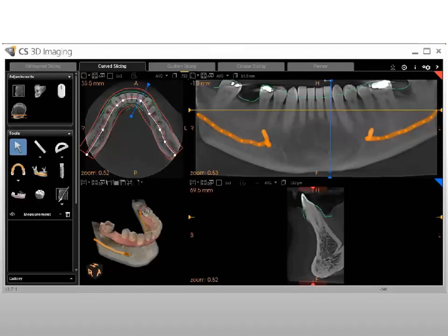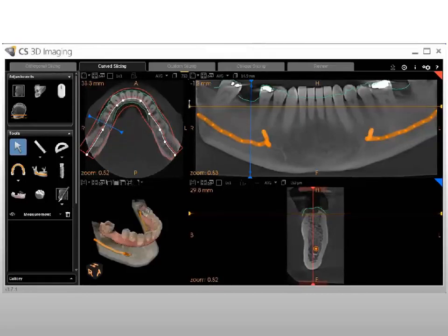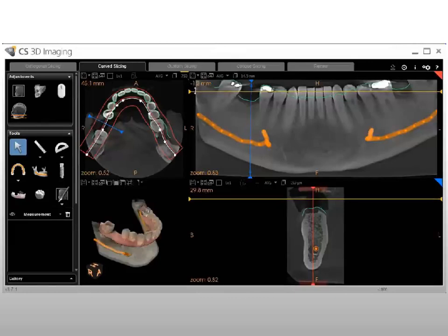To optimize crown placement, set the blue vertical grab handle of the axial plane at a right angle in the reconstructed panoramic view screen, and set the yellow horizontal grab handle with reference to the occlusal plane and the position of the adjacent teeth.